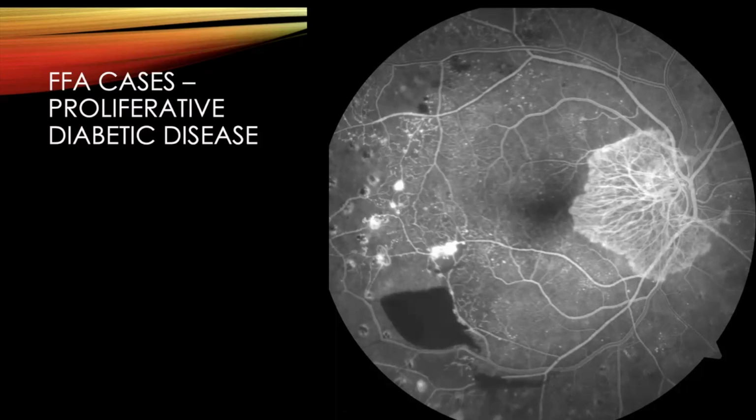And then you've got lots of findings that you can see. Most notably, you can see an area of neovascularization at the disc. Along the inferior arcade, there is some blocking. I can't say for certain what that is, but there is a fluid level line. This suggests perhaps a pre-retinal hemorrhage, blocking the vasculature underneath. And you've got areas of capillary non-perfusion here and here along the inferior arcade, suggesting an ischemic eye. And these areas here of hot spots, again, suggest either aneurysms or other areas of neovascularization elsewhere, for example, here.